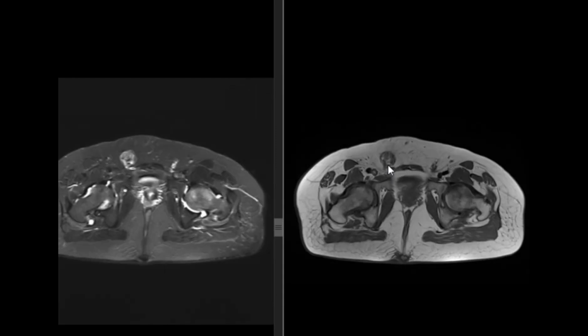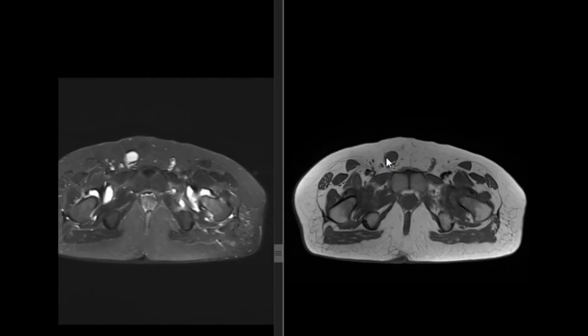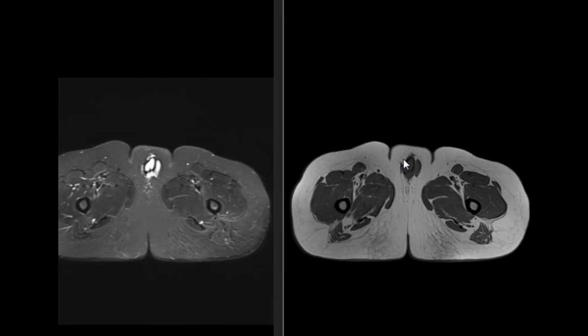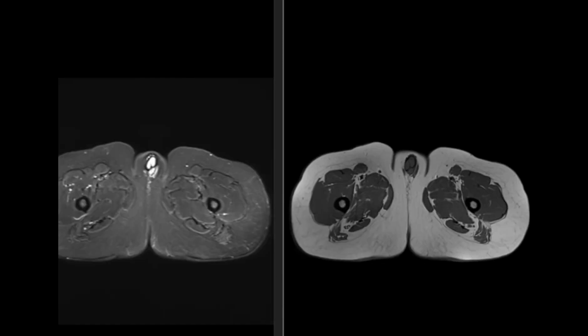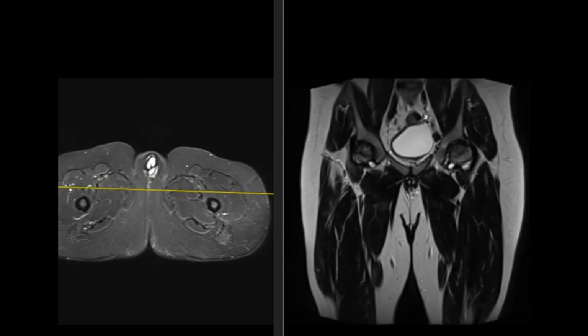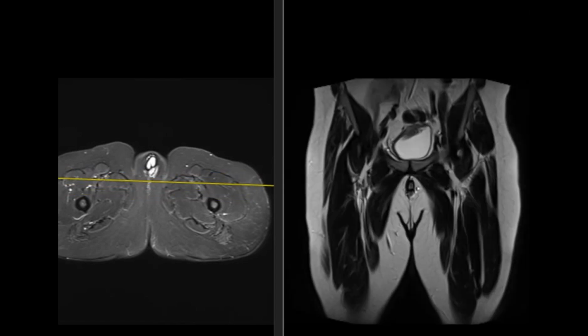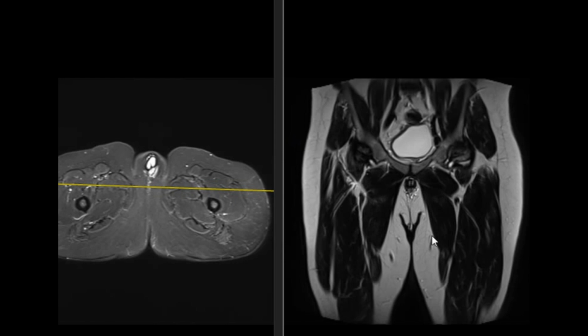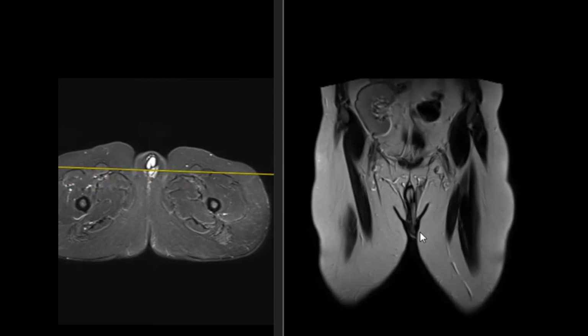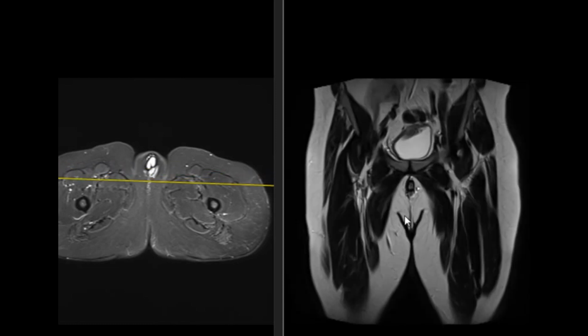Okay? It's empty because both testicles are up. It's collapsed. If you want, in the coronal it may be clearer, or let's see this coronal. The scrotum is empty, this here is the scrotum. Nothing. This is the penis. This is the scrotum. Okay?